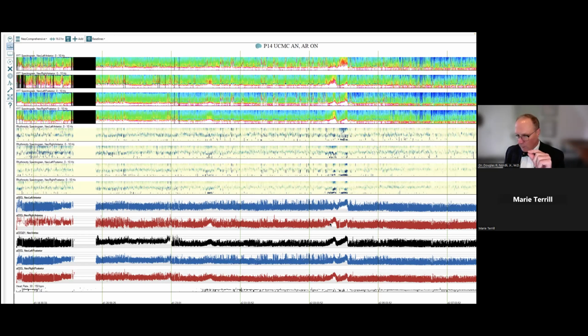So, by the way, why did this happen? It happened because there was an increase in amplitude and it was sustained. So there were fewer epochs where, in that time period, there was a lower component of amplitude activity. So very little low amplitude activity in the epoch and much higher amplitude, which is why the lower portion of the line goes up.